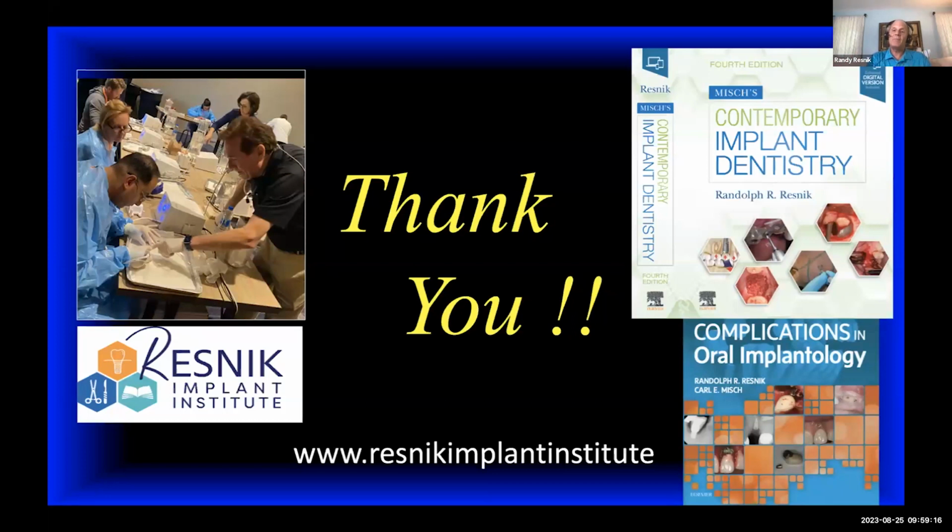All 3 of them are together, and there are different nerve fascicles and different blood vessels to go to each tooth. What happens when you take out the tooth? That canal is still there. Without the tooth there, it becomes necrotic, but sometimes that's delayed because the body has to basically resorb it and grow new bone into it. So you can drill through it, you can cut it, you can do whatever you want, and it's not going to give you any neurosensory impairment. The only area that you have to worry about, that is the lip, chin, and anterior gingiva, is the mental branch, or back in the posterior, which would be the inferior alveolar nerve.